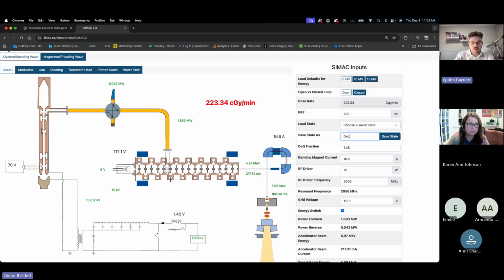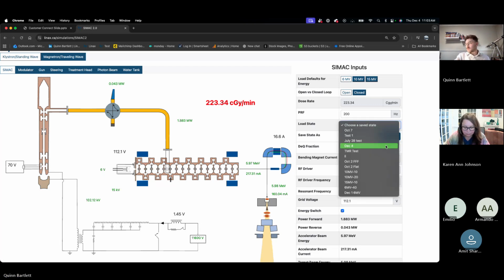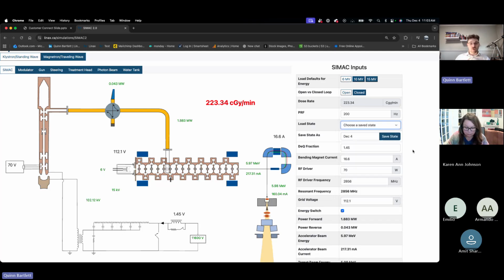So if it was December 4th, I can save this, and there's my save state, and then I can call that back. If you want to teach and demonstrate, or just practice and learn, or investigate beams or research, Simac can really help you out. That's why we created this webinar, just to get you more familiar with what's available on the platform and how to get into that.